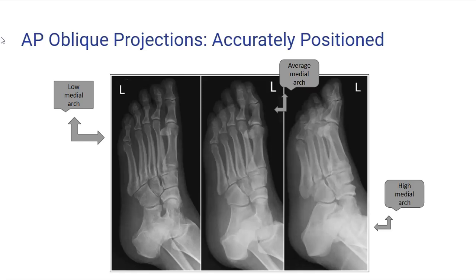Well, let's refer back to our AP foot projection. When you conducted the AP foot projection, which usually is done first in the series, was the central ray less than 10 degrees to open those joint spaces? Because sometimes those joint spaces at a 10 degree central ray are still closed and it's too much angle, so you may have to decrease.